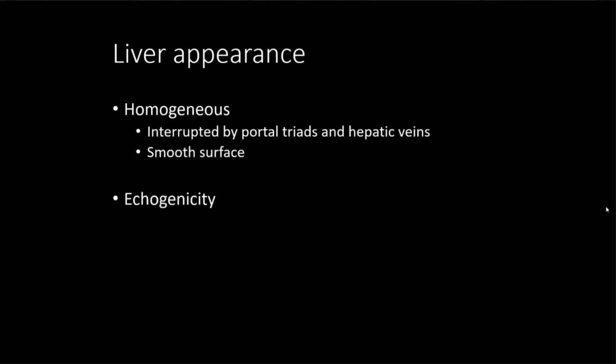Anybody want to chime in? Chat box? Talk? Yes, it's about the same. And how about for the pancreas? Which is more echogenic? Here's somebody typing, maybe. I don't know. Oh, there we go. Liver is more echogenic.